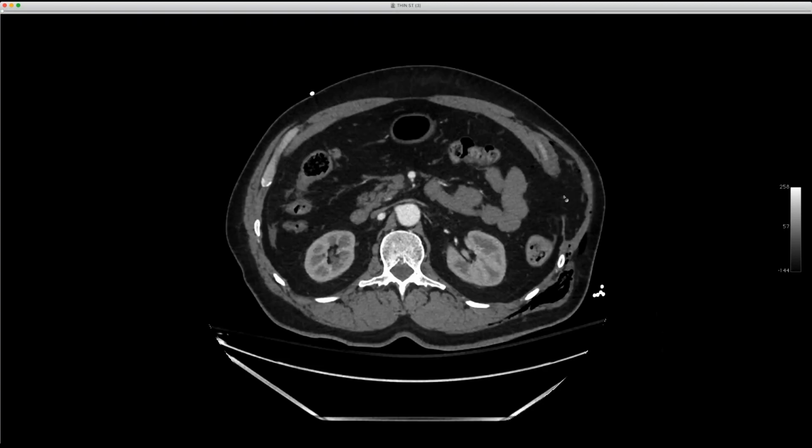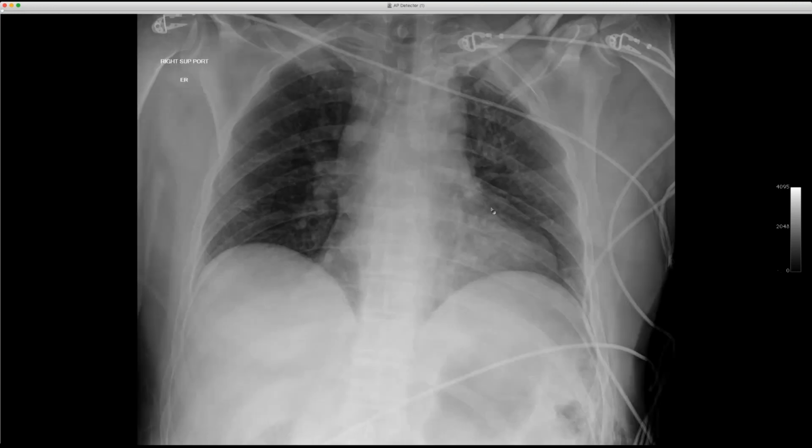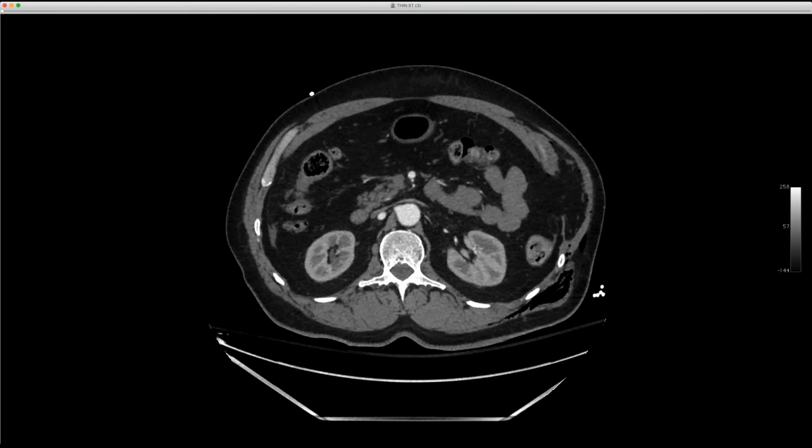And there's the radiograph of when he came in. You see the subcutaneous gas and the fractures down here, but a normal contour. Usually we're looking up here, but there was an apical cap tipping off at least that something was abnormal in this patient. I'll throw up a coronal as well.